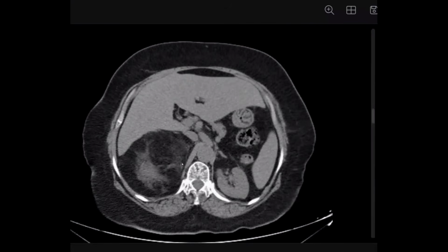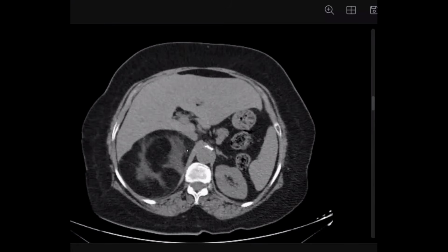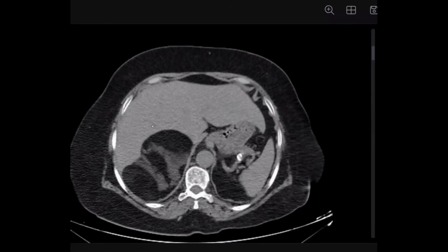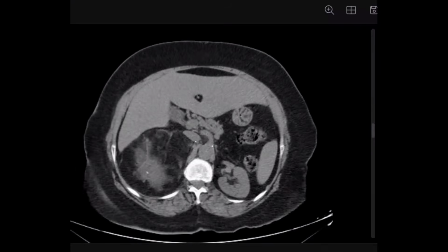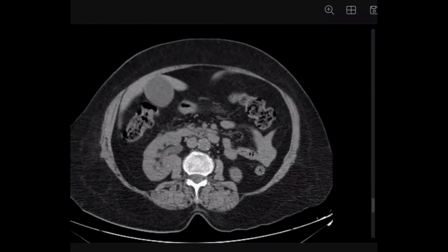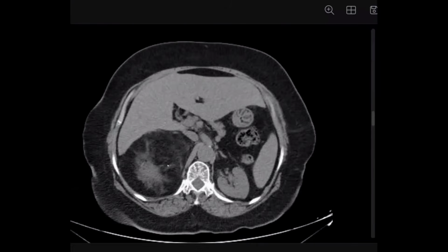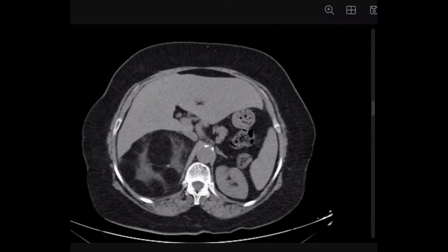As you described, we have a large retroperitoneal mass. It is centered upon the right adrenal gland region, and it is smoothly indenting the right hepatic lobe anteriorly. It is displacing the IVC medially. It is displacing the kidney inferiorly. Well done. You should correlate with the coronal plane to check whether it is arising from the kidney or not. It's not arising from the kidney.